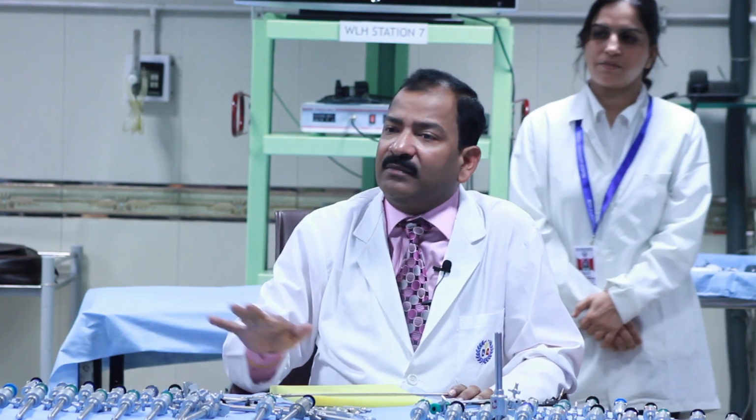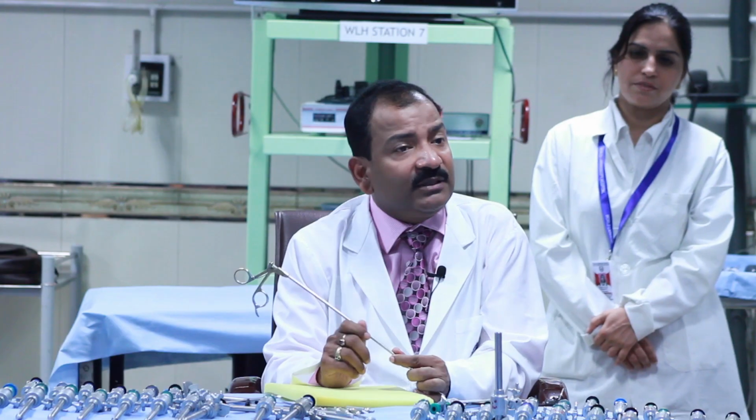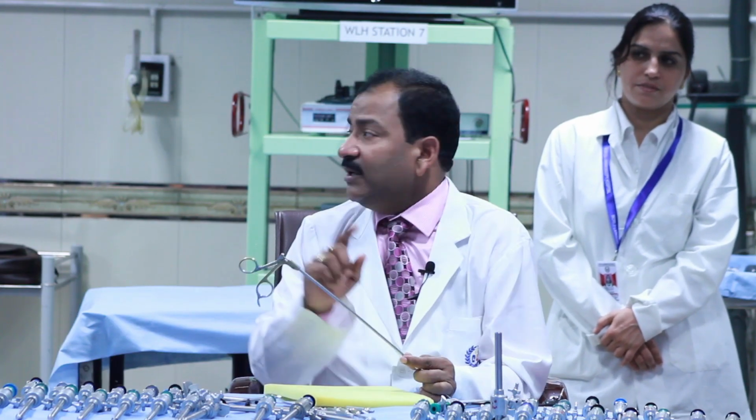So, if you have to lift the tube, see the ovary on the other side, sweep the bowel, retract the cecum, your elevation angle should be 30°. Then you can do it. Otherwise, you will cry, you will struggle like anything.